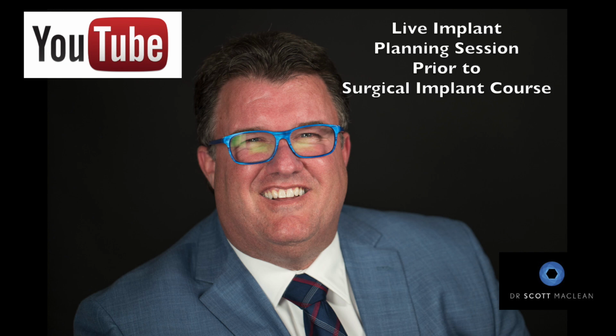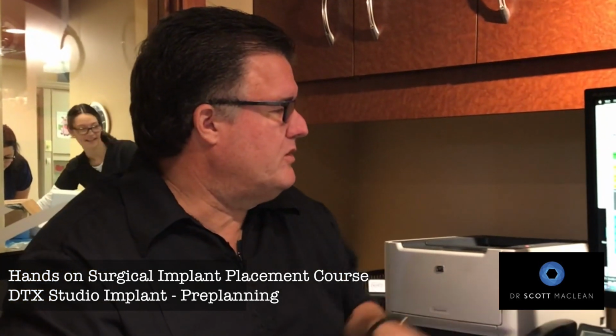During this session, I'll be demonstrating how to use digital technology to plan an implant placement using guided surgery. This was part of a live hands-on course where the students got to place implants after planning and then making templates through printed technology. What we're going to do is an introduction into Nobel Clinician, which is now called DTX Studio. With DTX Studio, there's going to be an application on your computer.